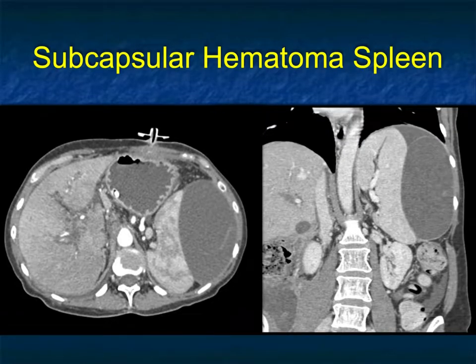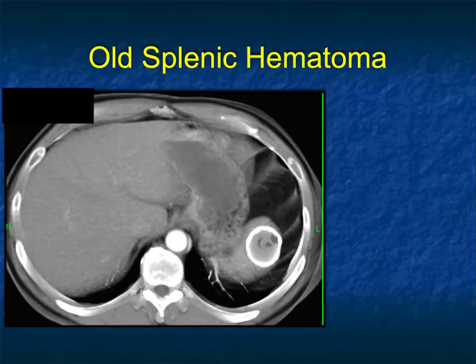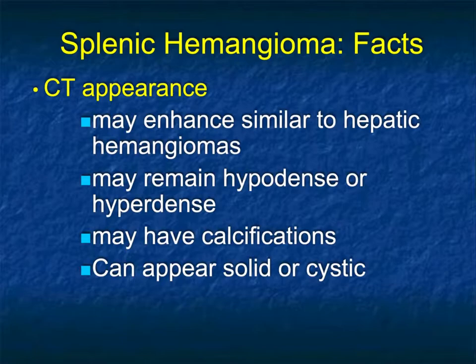Patients with subcapsular hematomas or subcapsular fluid collections are more likely to get spontaneous splenic rupture without any trauma, or with trauma can easily rupture their spleen. And just a very nice example of that. Now, when I see dense calcification, be it the kidney, the adrenal, or almost anywhere, I'm thinking about old hematomas. Dense rim-like calcification, yes, I could think of fungal disease or infection, but usually it's thin calcification and it's not circumferential. When you see thick circumferential calcification, it's typically an old hematoma.